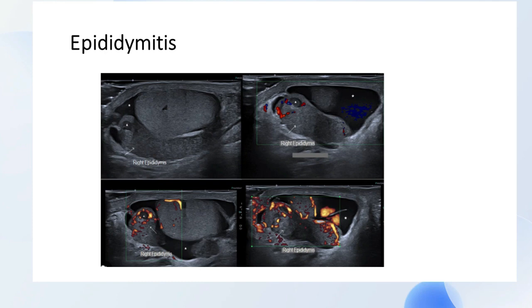In chronic stages, just like what I said for the appendage of the testicle, it shrinks, it undergoes necrosis, and at the same time it can calcify, or sclerosis can take place, and if it dies, it means there will not be flow as well.